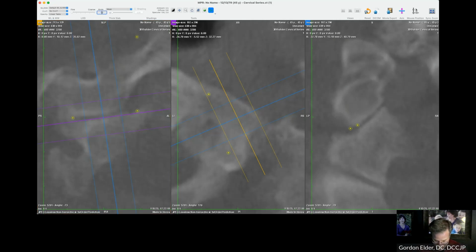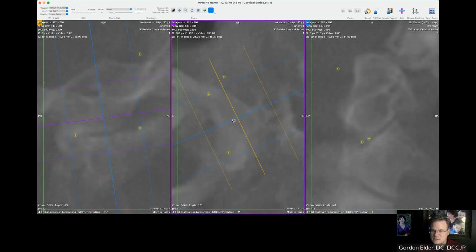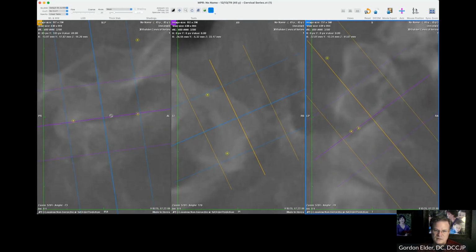Let's go a little bit less clear. Let's look at the whole joint and see if maybe we're not looking at exactly the right spot. If we do 20, all right, good. Still looks like an underlap here if you draw a line 90 degrees to that joint.